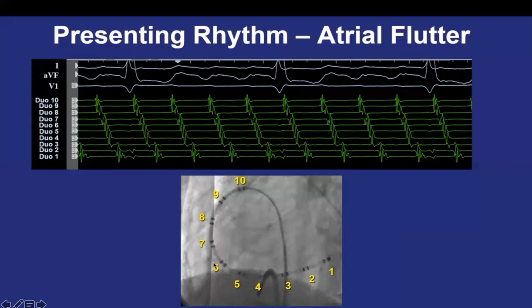So if the breakthrough is up, this is clockwise; if it is down, this is counterclockwise. Theoretically speaking, if we think clockwise going up, down and counterclockwise going up, down, both of them should give you negative. Saleh?